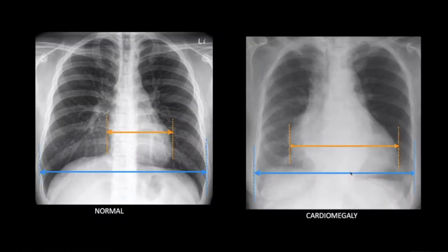On normal radiograph of posterior anterior projection with good inspiration and no significant rotation, the cardiac size should be less than 50% of the thoracic diameter. Cardiomegaly is labeled when the cardiothoracic ratio is more than 0.5. Upper limit of 0.55 is used for Asian and African population.